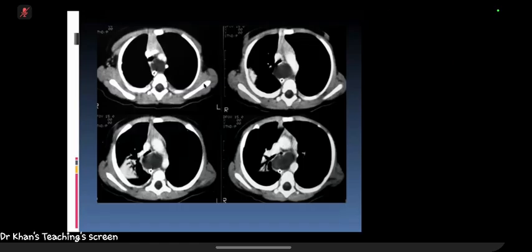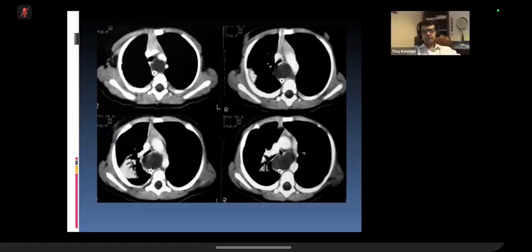So the CT confirms the mass to be predominantly in the posterior or middle mediastinum, actually, because I think there's a gastric tube. Yeah. So the esophagus, it appears to be anterior to the esophagus and posterior to the heart. The lesion is of homogeneous low attenuation, and I can say that was cystic density.